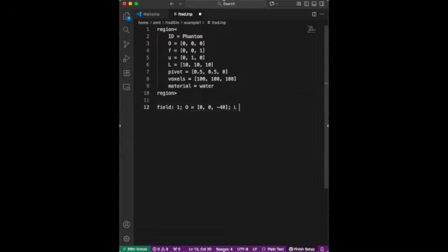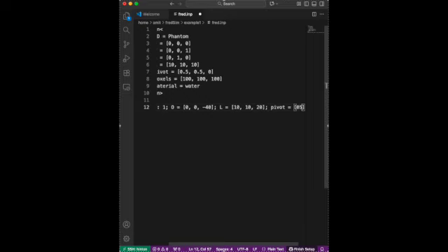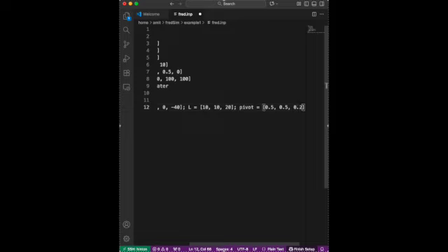Yeah, of course I have to define the matrix, the field box. I was thinking why not just give a point and let the proton come out of it, but it's not efficient to do it that way, or it would not be a realistic case to just give out some protons of certain energies and them not undergoing any spread or convergence or divergence. Yeah, I hope you get the idea.